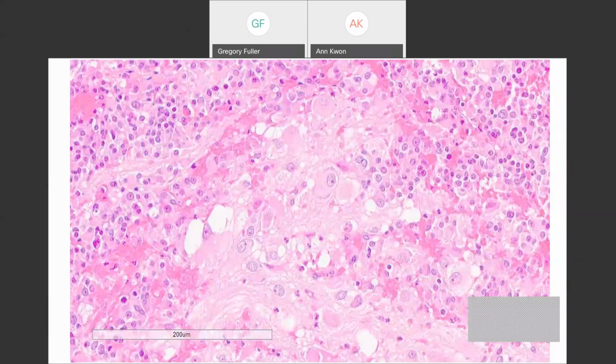Somatotropic pituitary adenoma. All right, Alex, good job. Crooke's cell adenoma, Anquan, I like that. Okay, what else? There's something else here, something big. Sanjay Singh, acromegaly. The patient absolutely was acromegalic. Yes, definitely. What is the tissue diagnosis?